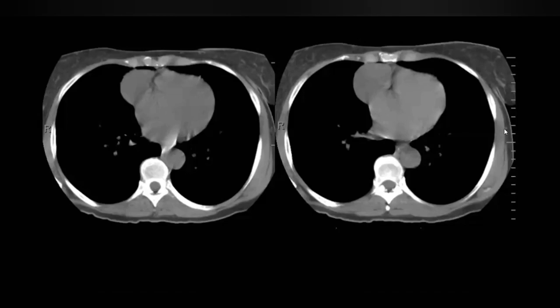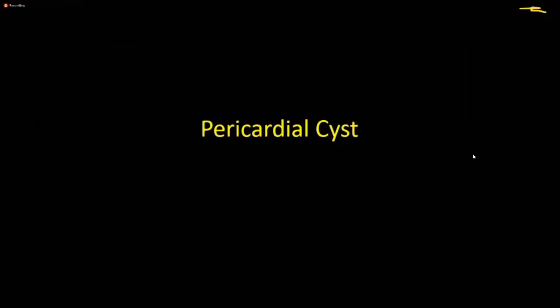I would like to confirm the density of the mass, if that's possible. Cyst. It's a cystic mass. So then a pleuropericardial cyst would be my top differential. Sure. So this is incidental finding, classical appearance, classical location of a pericardial cyst. Like 90% of them will appear in the right cardiophrenic angle, 10% will develop in the left cardiophrenic angle. Extremely benign, rare, leave me alone lesion, okay? Usually you don't need to intervene with these cysts.